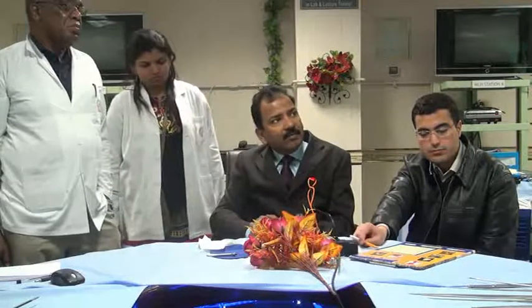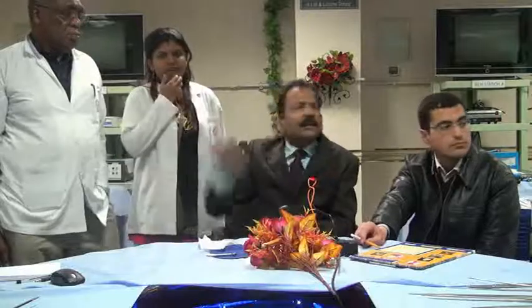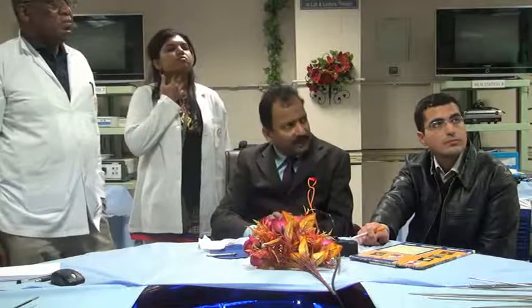These days, a common misnomer in the market is that for laparoscopy you should have either a cathode ray or an LCD monitor. Actually, cathode ray is CRT. So they say either you get a CRT or you get an HD monitor. But these LCD monitors are now coming with an HDMI port. Actually, only LCD doesn't work.